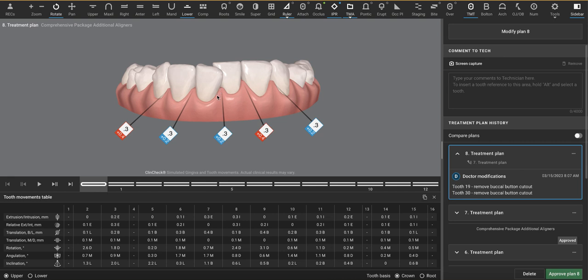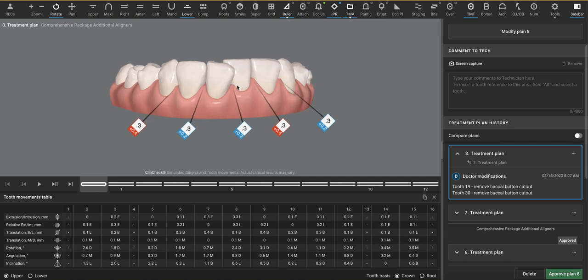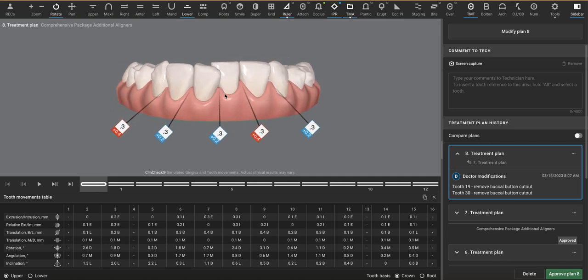When we have anterior crowding, this is true on the upper or the lower, the interproximal bone and the interproximal tissue is not the same as teeth that are not crowded or not overlapped. So if you think about it in your mind's eye, where is the bone on this tooth? It's farther down in relation to the future contact point. Let's draw a parallel situation. Contact point, level of bone. Over here, because of the crowding, the bone is actually farther down on the facial surface of number 24 here.